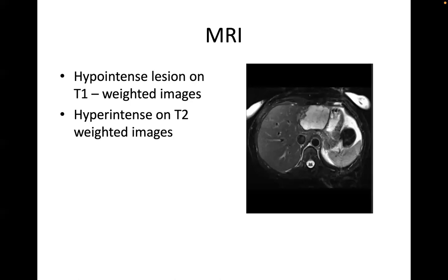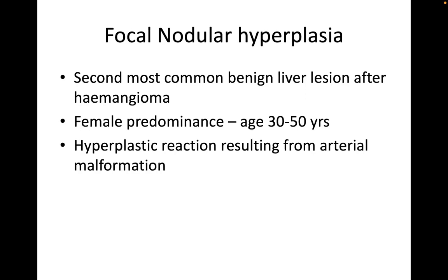So this is our hemangioma. Once we have made the diagnosis and the patient is asymptomatic, then we advise them accordingly that they don't have to worry. If they are very concerned, you can make a follow-up and maybe repeat the imaging with ultrasound after 6 months or so.